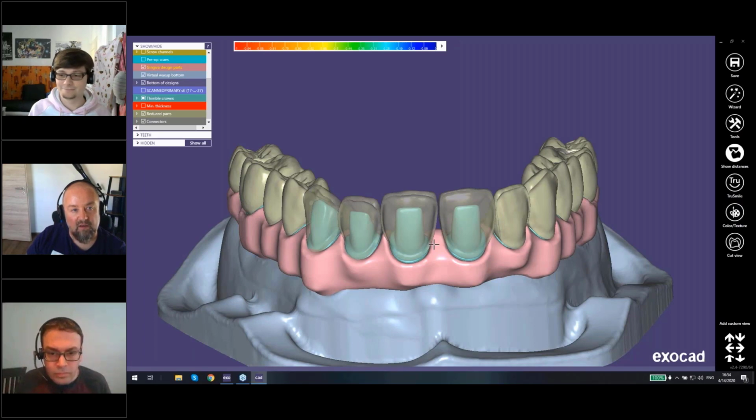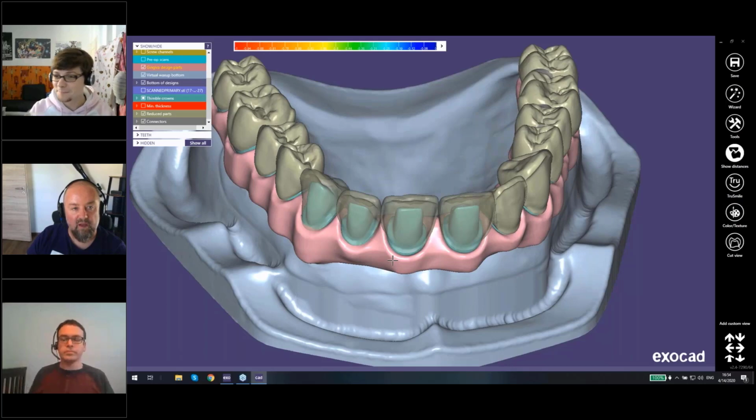Okay, there was a question right at the beginning about curves in the implant geometry. Actually, in the construction info, we export the position of the implant geometry, and we export the curve of the emergence profile border. But we are actually not able to export the curves of the implant geometry.